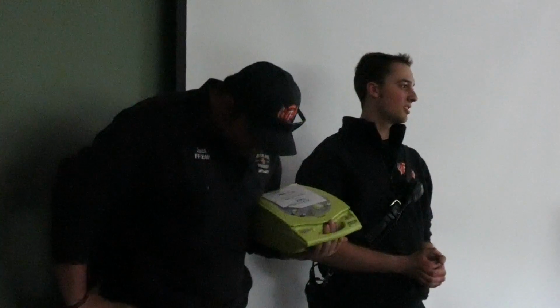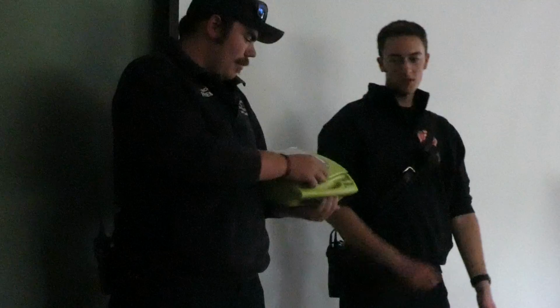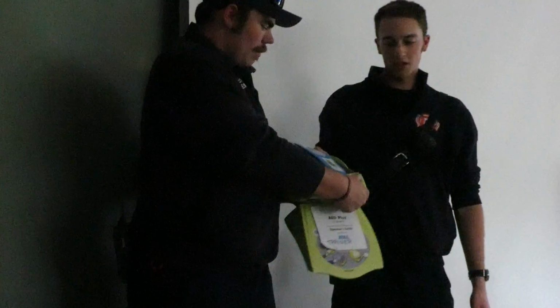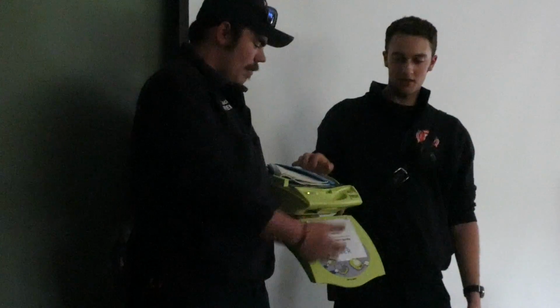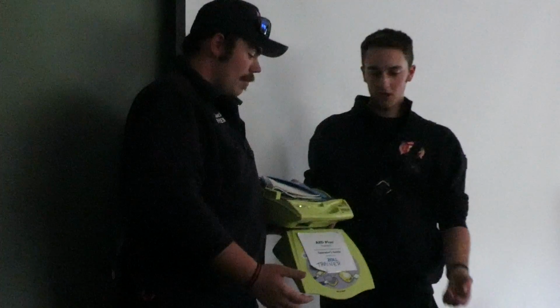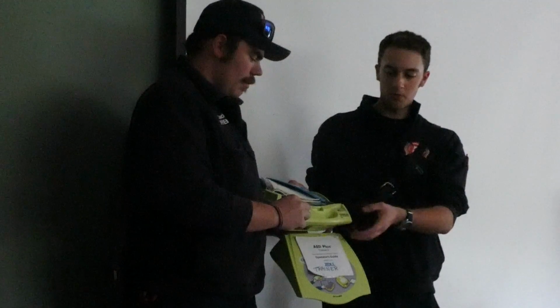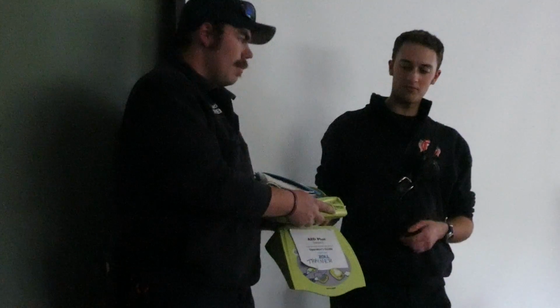Alright, so if you have other people around you, and this person is unresponsive and doesn't have a pulse, you're going to start doing CPR and call for somebody around you to call 911 and grab an AED if you have one around. And so, super simple, just open the cover and turn it on and a green light lights up. Automatic defibrillator. Unit OK.